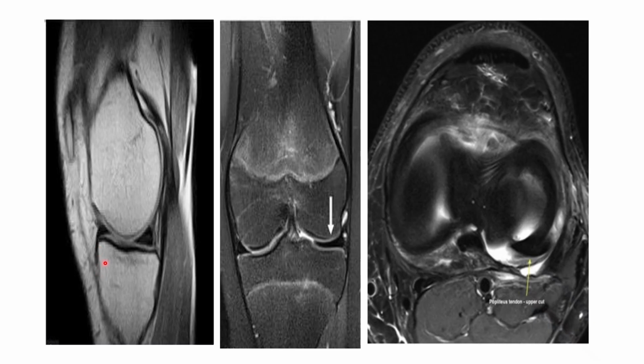You must remember that the posterior horn is usually larger than that of the anterior horn. In the sagittal image we can see this is the posterior horn and it is always larger than that of the anterior horn. Now in coronal MRI, we can evaluate the body, peripheral margin, and we can also see the extrusion and root attachments.